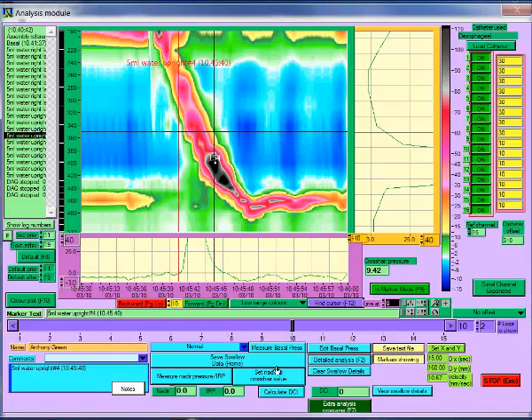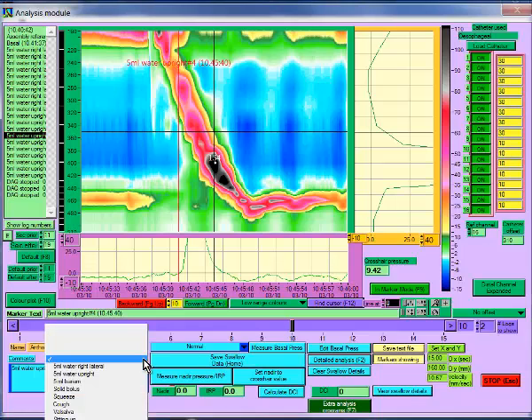All of the buttons and text boxes below the purple bar are involved with analysis and reporting. The name of the patient is displayed on the left. When in marker mode, the current marker text is displayed in the comments box. If the marker is incorrect, you can pull down on the list of comments above this box to enter the correct comment.